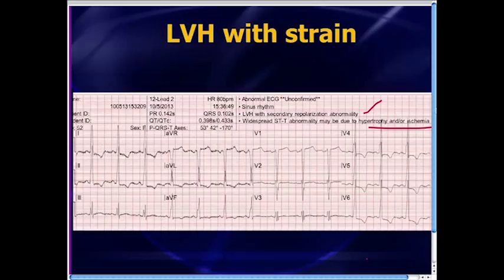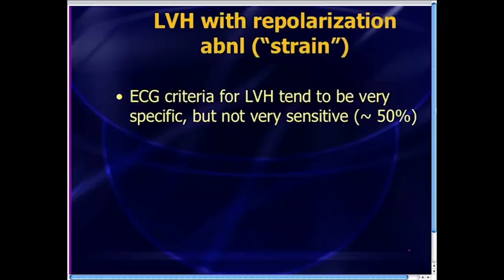So let's talk about left ventricular hypertrophy. Let me preface this by saying, although I love electrocardiography, I hate LVH. I absolutely hate LVH. If LVH were a baby, this is a baby that even his mama would hate. I don't think anybody likes LVH because the EKG criteria are so difficult. First of all, the EKG is not even all that sensitive for picking up LVH. It's only about 50% sensitive. It's pretty specific, but the sensitivity for the EKG to pick up LVH is not all that good. The real diagnosis is based on echo or cath.